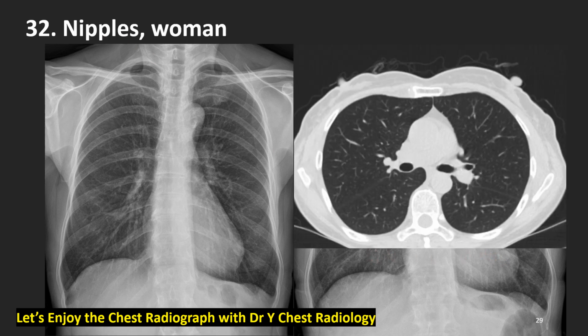Yes, they were nipples. Normal nipples. She doesn't have any abnormal findings in the lung. No pulmonary abnormality at chest CT.